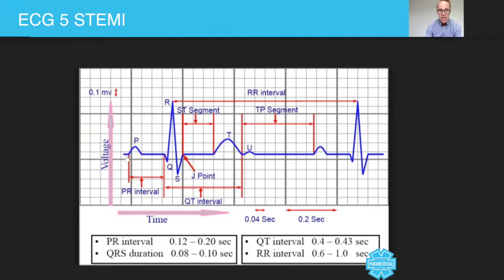Now on this normal ECG, notice how this line stays consistently straight. However, somebody who's having a STEMI, this J point rises above the ECG at least two small squares. So that would be what we call a STEMI. So let me show you what that looks like here.